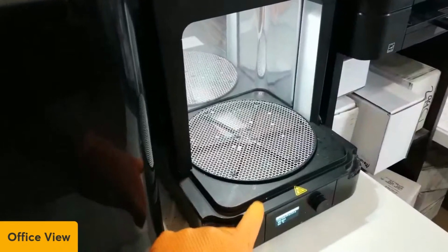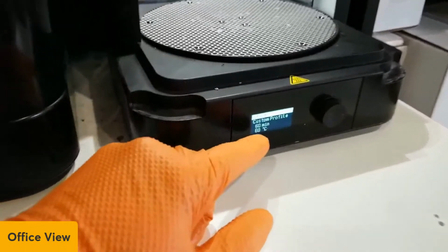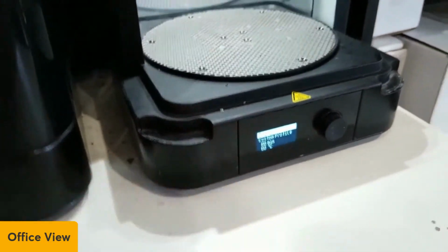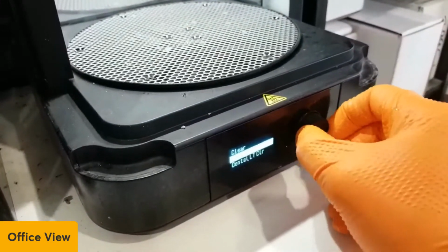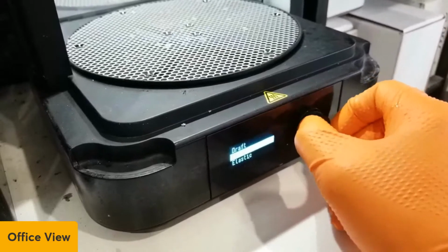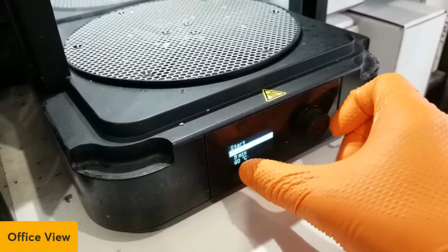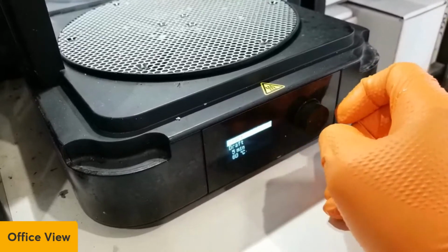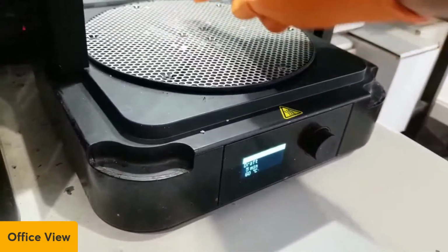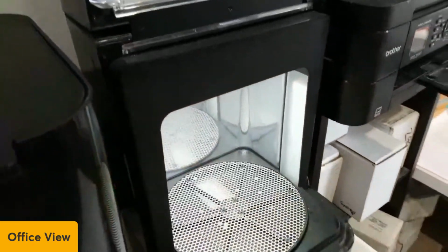So this is my, this cures for 5 minutes. Again, the power went out on here. I didn't realize that. So this is set for, you choose the resin you use. There's a lot of resin you can choose from on Formlabs Draft, which sets the temperature to 60 degrees Celsius, which is pretty hot, and then 5 minutes, and then you can press start. And this thing will rotisserie around, and the light will cure from underneath, and this will cure, and this light will cure, and this light will cure. So we'll get to that in a second.